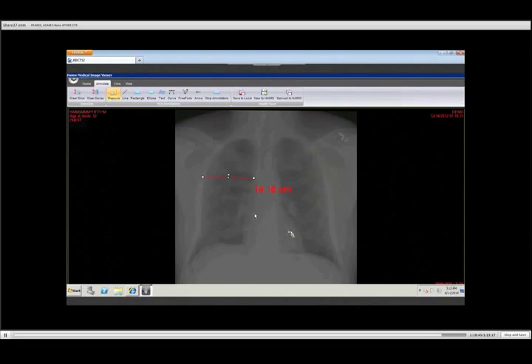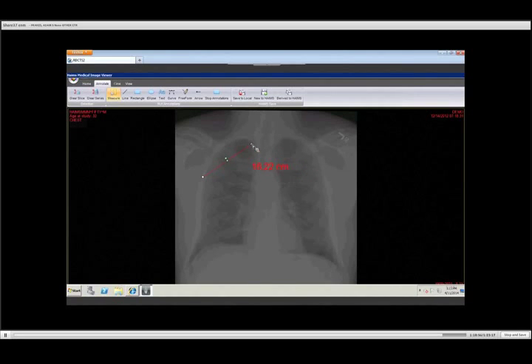And I'm going to change the font a little larger so that you can see it better. So you notice I now have 14.16 centimeters on the rib or the lung, and I can drag it, move it around, make it larger, smaller. I even have the ability to do rectangles, boxes, ellipse. I can even freeform if I choose to. Make all kinds of different annotations. I even have my text box where I can type something in.